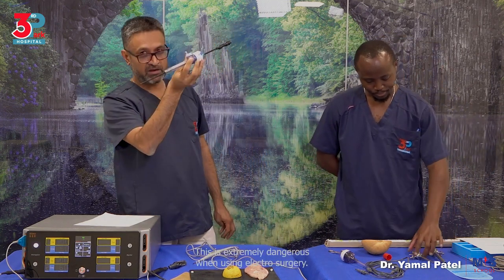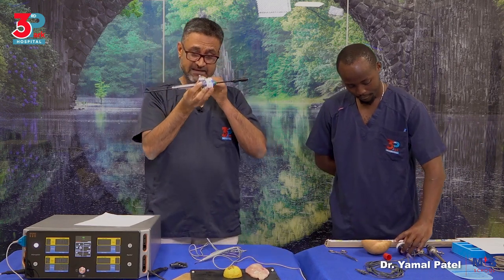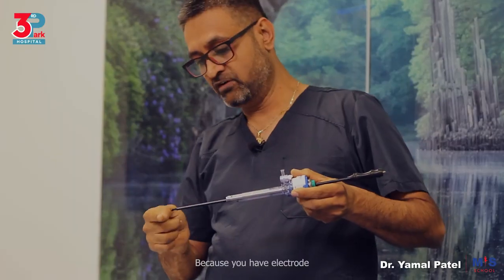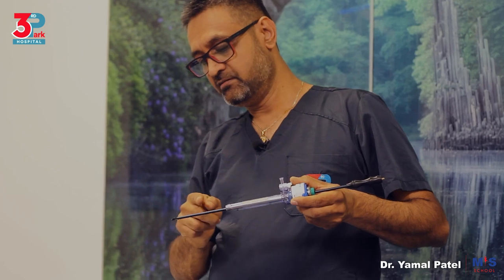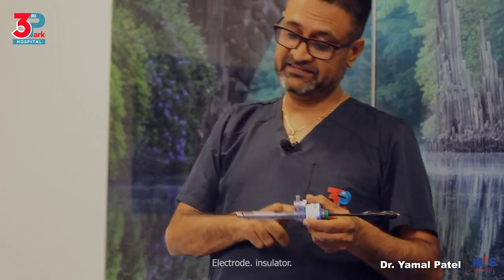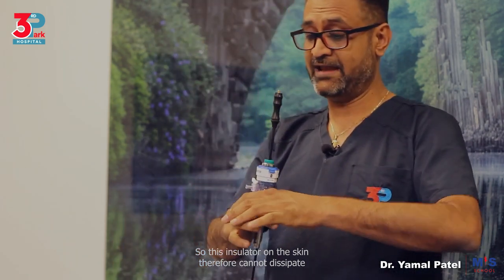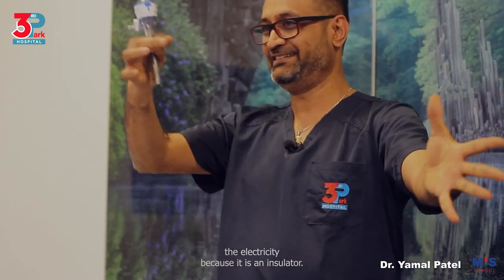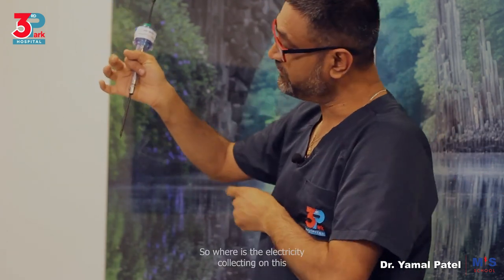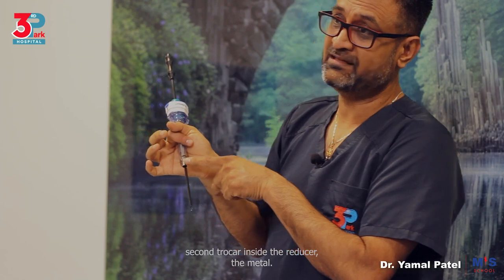This is extremely dangerous when using electrosurgery. Why is it dangerous? Because you have electrode, insulator, electrode, insulator. So this insulator on the skin therefore cannot dissipate the electricity because it is an insulator. So where is the electricity collecting? On this second trocar inside, the reducer, the metal.